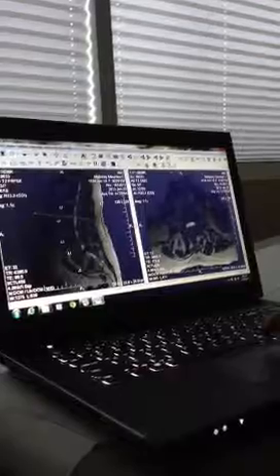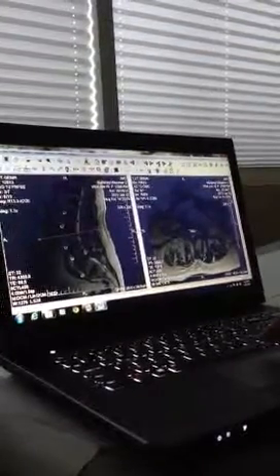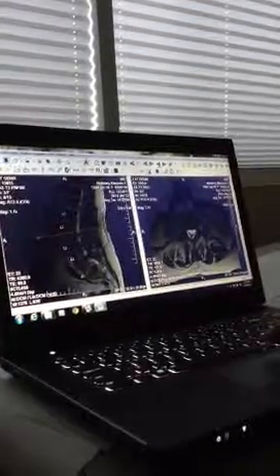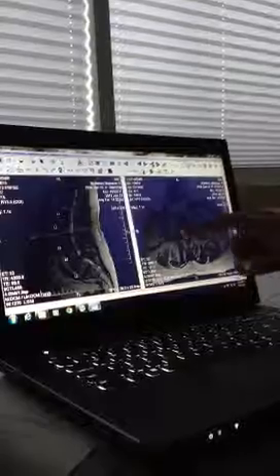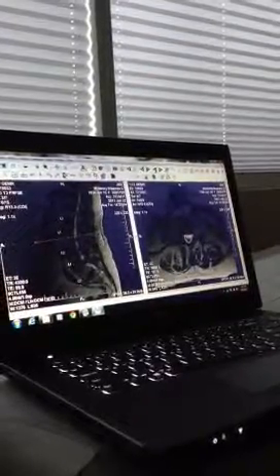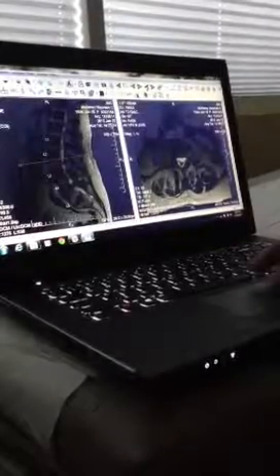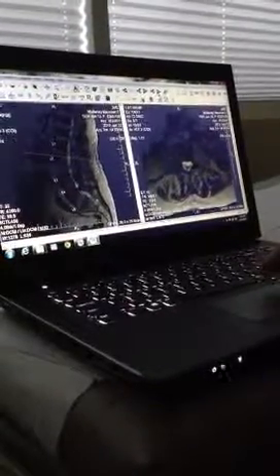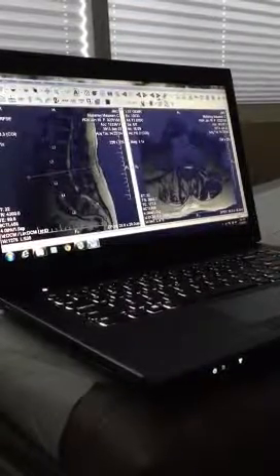Now we're going to go down to L2-3. And notice, very importantly, when we're not at the level of the disc, look how nice and wide the spinal canal becomes. So the problem isn't the bone. The problem is the disc. So let's go down to now L2-3. Okay, so this is L2-3.